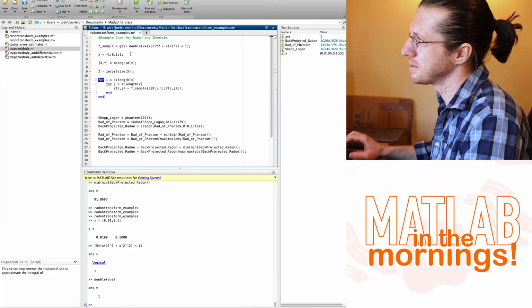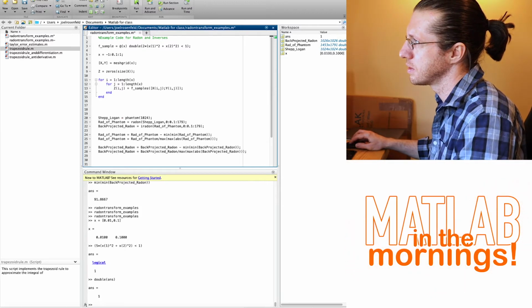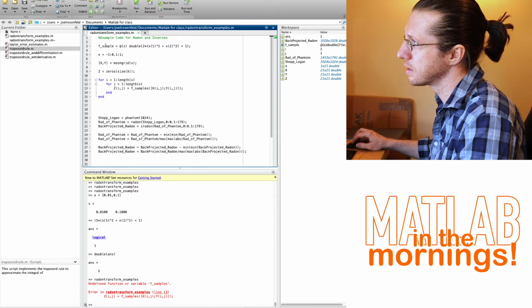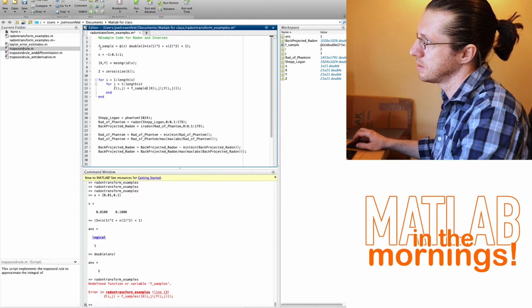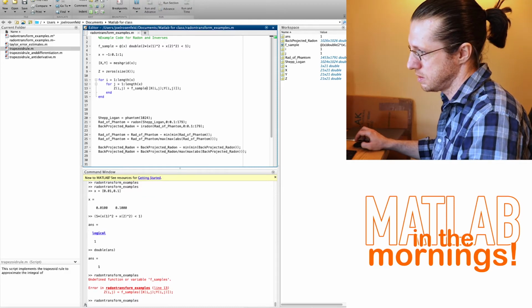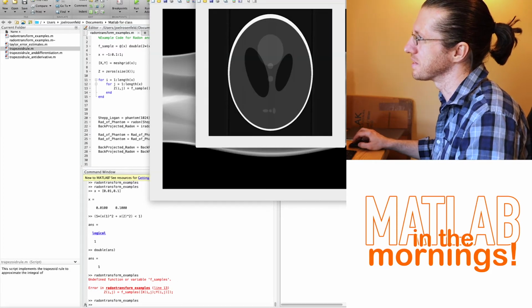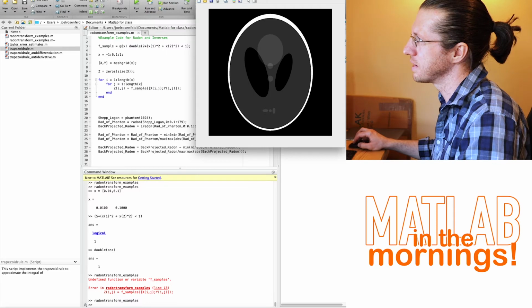End. So let's go ahead and take a look. Boom. Oh, sample. All right. Oops. Still had all the other code in there. Didn't mean to have that. All right, but let's see what we got out of this.